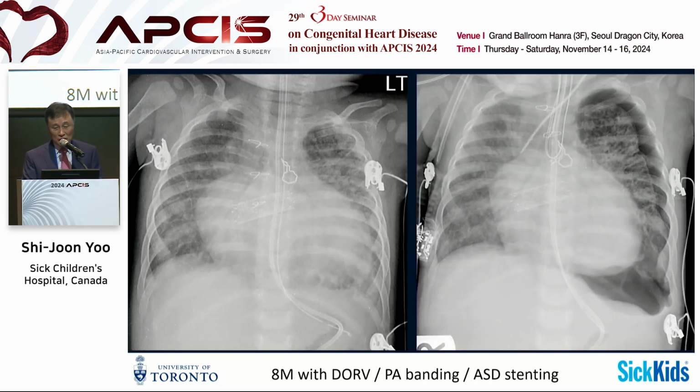Okay. So here in this case, you can see that on the left side, right side, there is a pneumothorax. Okay. And then can you see that some tubular structures here in the upper lung? I'm not showing this finding. So what it is here is that they developed a pneumothorax with interstitial pulmonary emphysema. I want to show this one back here.